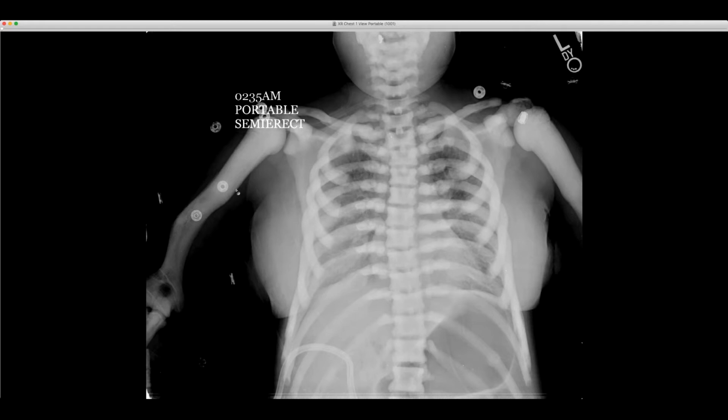It'd be a lot of artifact, but just really, really dense bones. You can see that there's this bent, sort of dysmorphic appearance of the humerus here as well, and thickening and expansion of portions of the humerus right here. So this is a case of osteopetrosis, just a really good case that just came in, of a young patient with osteopetrosis. Really, really dense bones, some dysmorphic appearance of the proximal humerus, and I just thought that was a striking example.